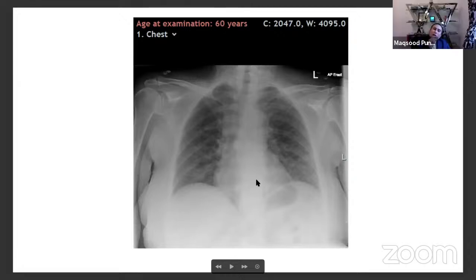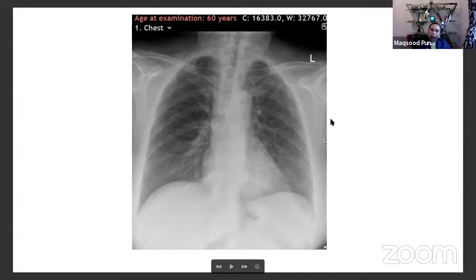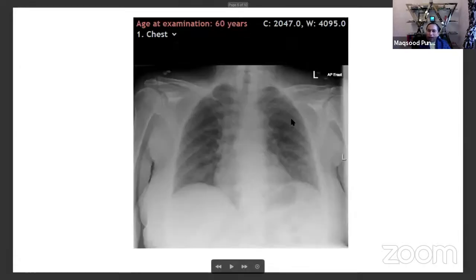Yes, just before that, because this patient had neutropenic fever, we straight away started treatment as part of the neutropenic sepsis protocol. The patient continued to spike temperature. That is why we repeated the chest X-ray. Could you kindly go through the full series?